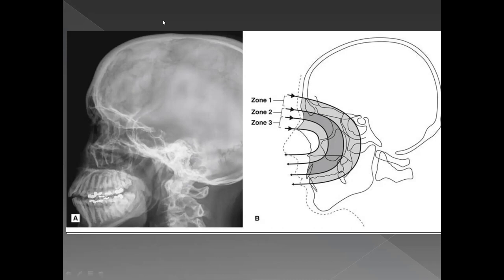Recently, a fracture at FZ level was not obvious on a CT, and the slices were 1 mm. Well, if you can share that picture, I'll have a look myself and see if it was obvious or not. Plus, it's possible it was maybe a non-displaced fracture, so maybe that's why it was not visible, or maybe you were looking at the wrong window. A fracture should be visible in a bony window. Maybe you're looking at the soft tissue window. On the soft tissue window, you can't see fractures very clearly.